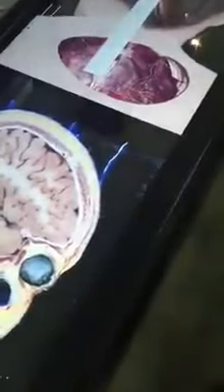And what's interesting is these are actually the scans that were done from the cadaver. So everything you see here is what we saw at 0.6 to 0.8 millimeter thickness. And so each time I turn around, slide through these sections, I can see the anatomy. You're not just limited to the head and neck, you also have areas like the brain, large areas like the thorax and the abdomen, all the way down to the leg and foot.